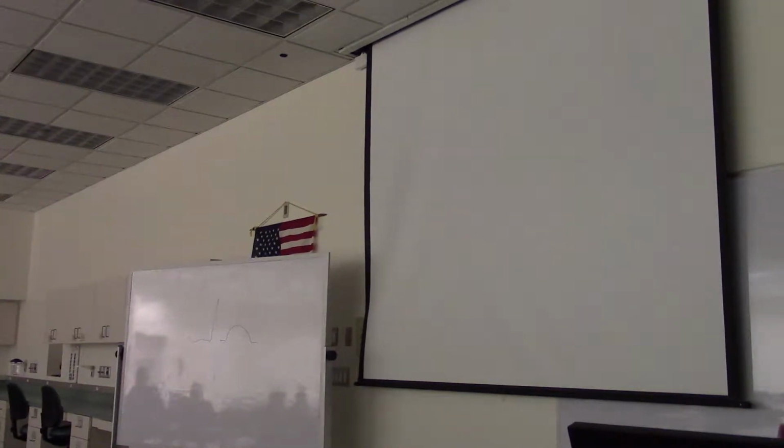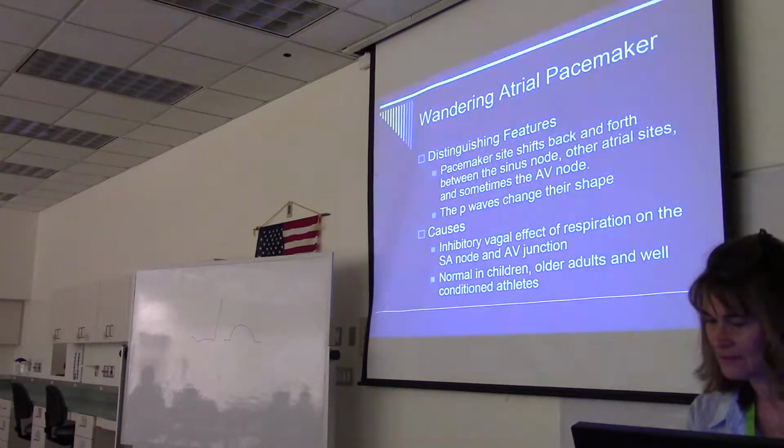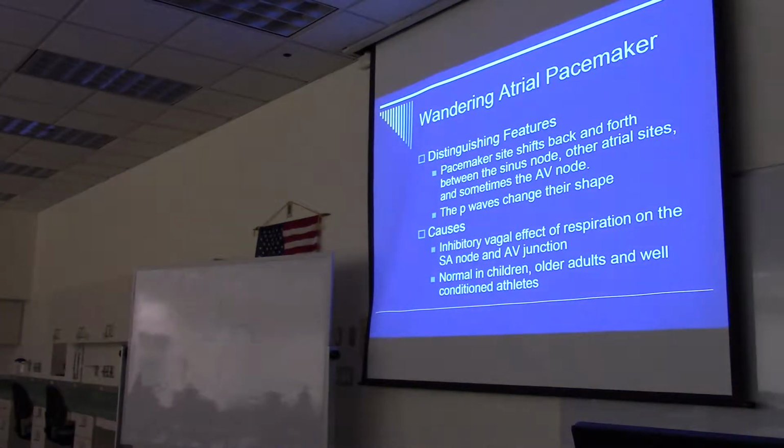Okay. We'll talk about some atrial arrhythmias. The first one is called the wandering atrial pacemaker.